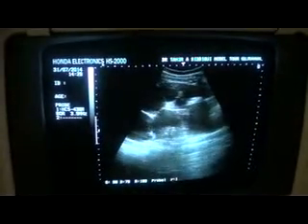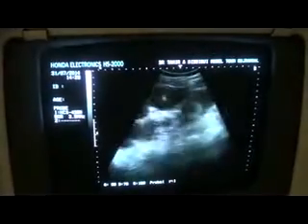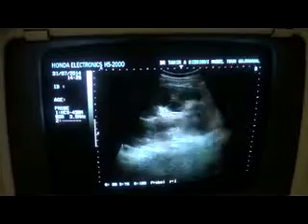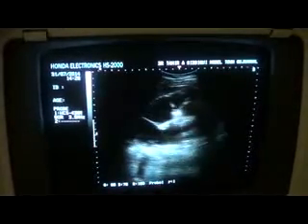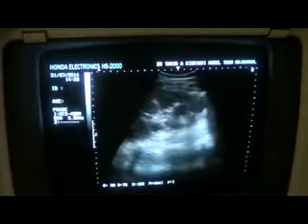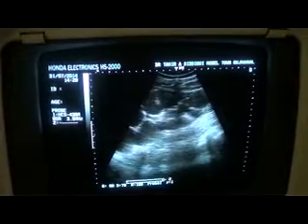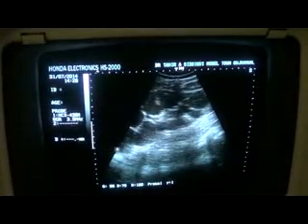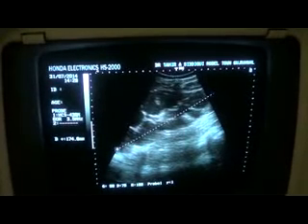Let's say, all cystic type, I am not saying cysts, I am saying cystic type areas are seen throughout the renal parenchyma, whereas the kidney measures in length approximately 17.5.